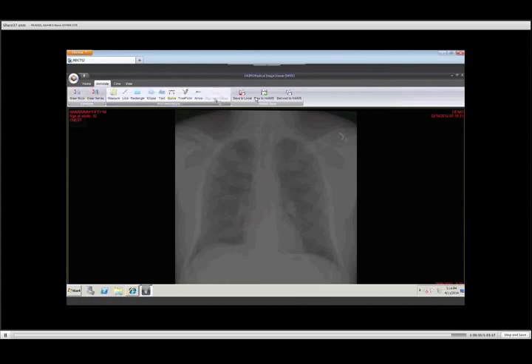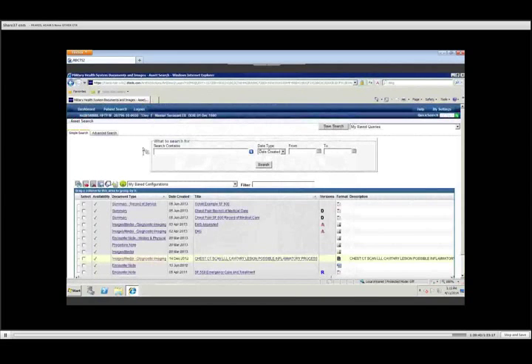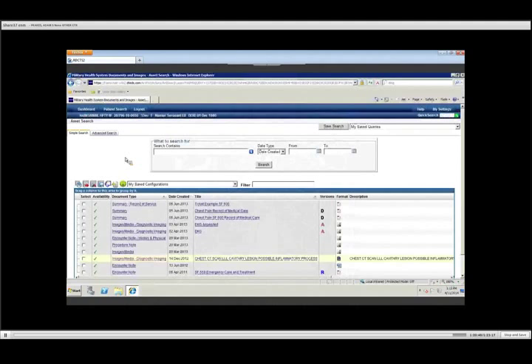So that is the HAIMS Medical Image Viewer. If I'm going to exit out, I simply click on the Rubik's Cube and hit exit. And that brings me back to my standalone asset grid. So that will conclude the HAIMS clinical training for Standalone and AHLTA. Do we have any further questions? Is there anything that anyone wants to see again before we log off?